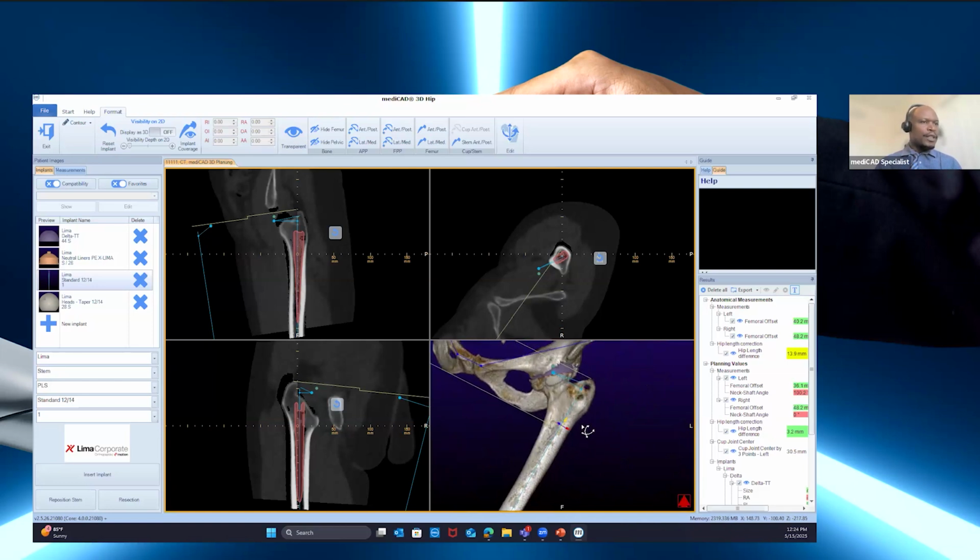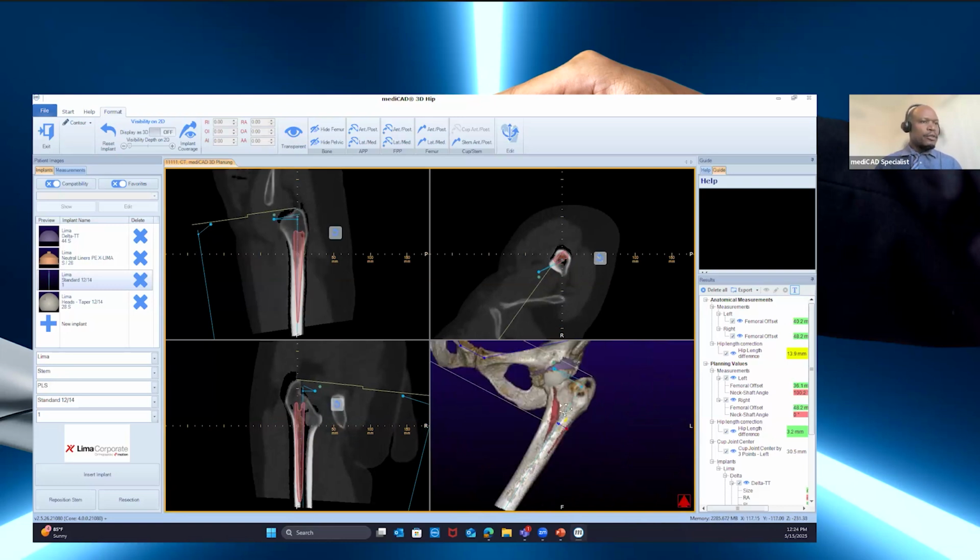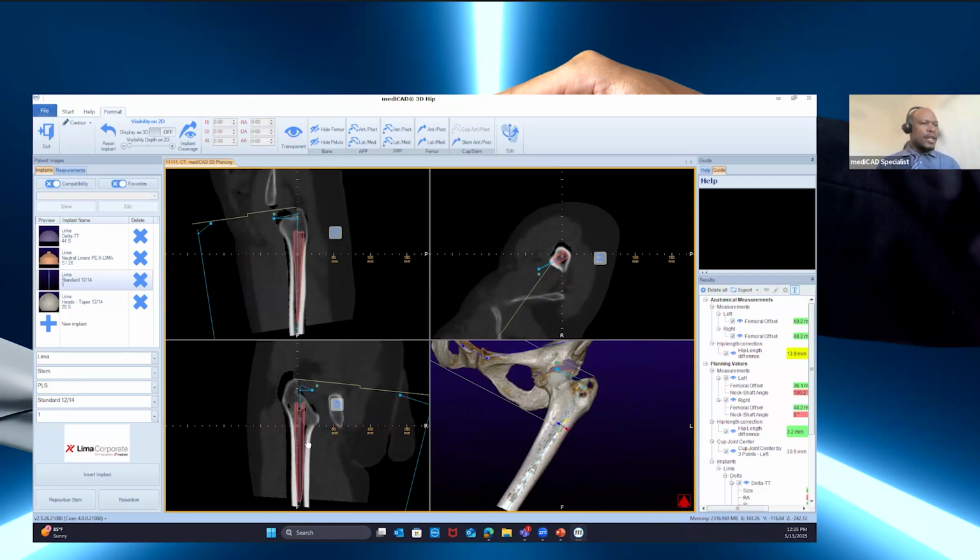Whether the stem itself is too big, you will kind of see it. Let's say if I move it like right here, you can kind of see the stem is oversized, meaning that it just seems like it's coming out. But that gave you the right view. Based on your expertise, you can say, let me know if this is the right size. If you think this is correct, or if I need something a little bit bigger, I think it's too small.